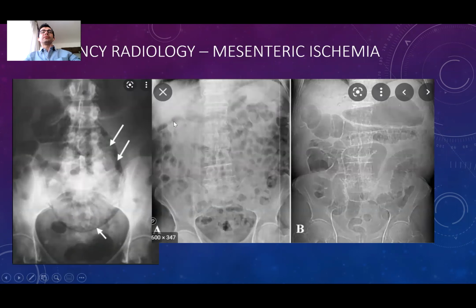The X-ray was normal in that patient, but in a typical case, the bowels get dilated because the peristalsis just disappears, because the tissue has necrosis and gas is produced. So this gas gets the small bowels dilated, and you see something like this. Also, when the gas content is relatively high in an abdomen, you can also think about that. In severe cases, when there is gas in the bowel wall, it shows like this.